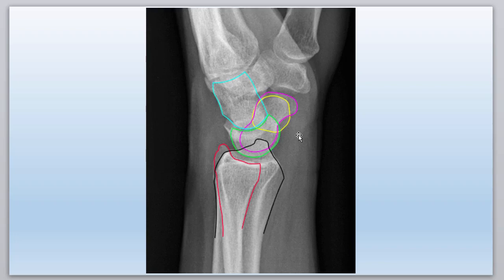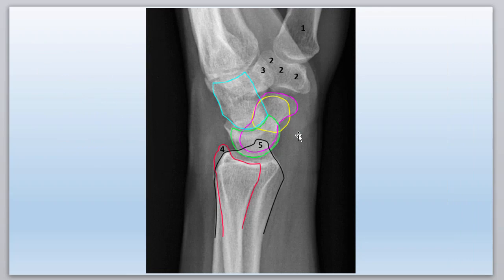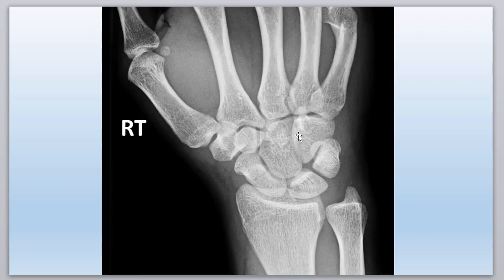Okay, then I added in the distal radius and ulna for your viewing pleasure. Even added some numbers there. You can tell where I'm going with this, so you can probably bet something like one of these is going to be on your final. Yeah, I really went overboard here, didn't I? Alright, so let's take a look at this. I think this is our last slide.